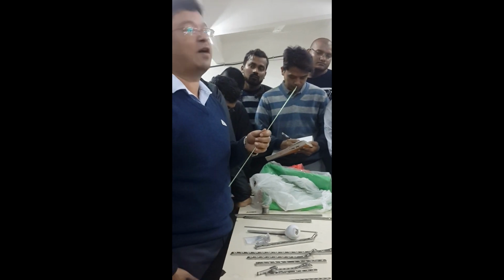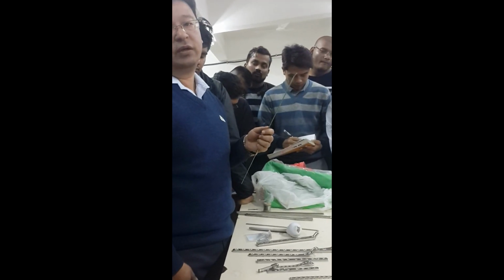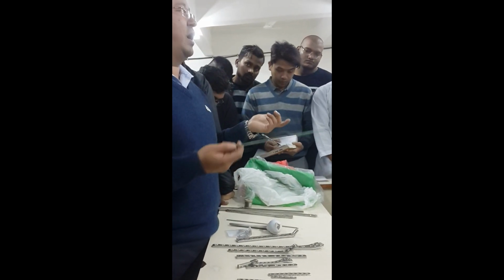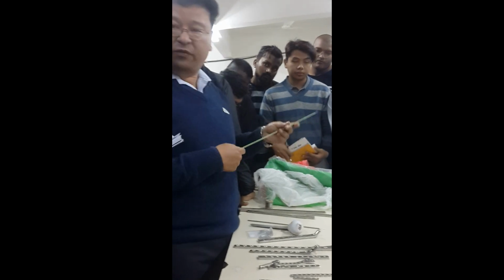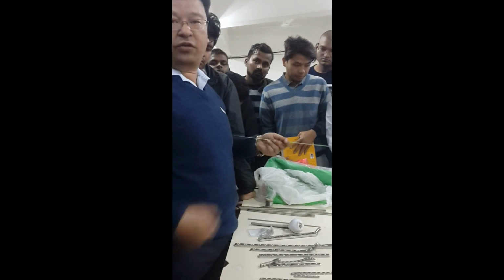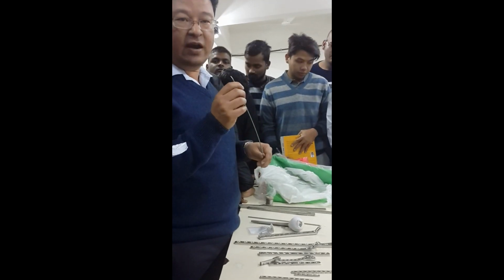Now suppose you have a shaft of femur fracture, and a plaster you have to put for 2 months, 3 months. With this, ideally you don't even put a plaster, but you are frightened sometimes it displaces, so at least 2 weeks. Then after that, only crutches, no plaster. So the advantage is that.